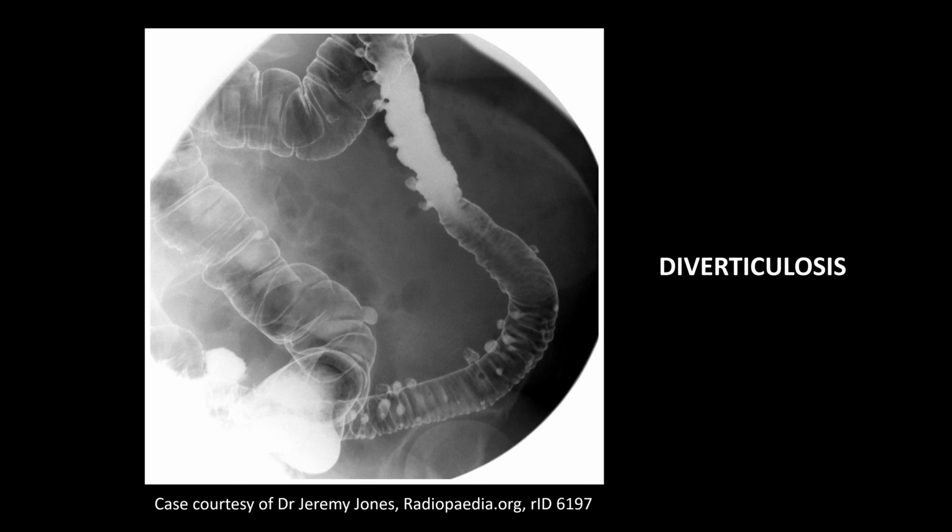In this image, we can see the small evagination from the large intestine. These are the diverticulosis.